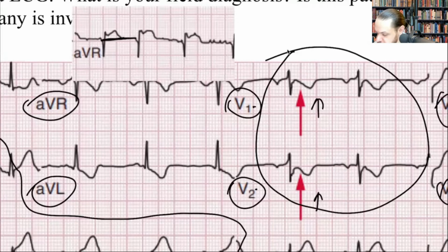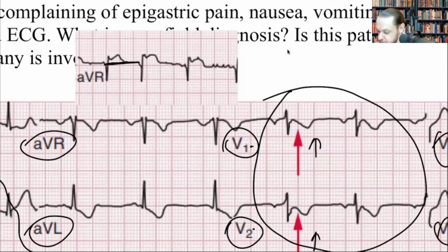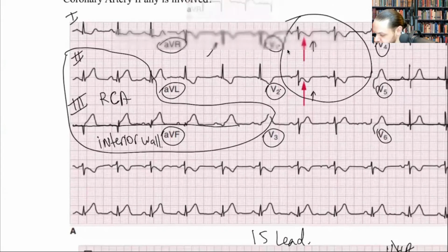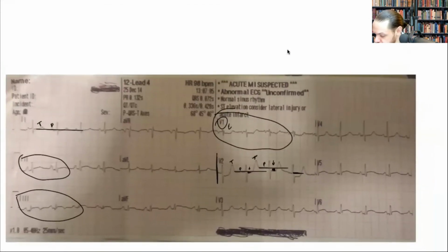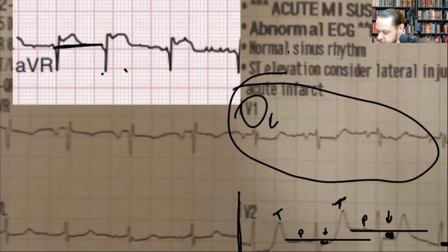You see the difference? This AVR is how it should normally be. Let me show you. This was my patient. This shows you the case we're working on now. So here we have elevations, here there's no elevations. So you see the difference?